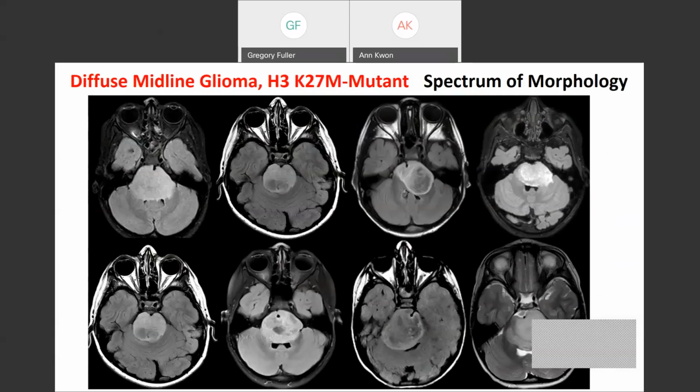These are eight different patients, so I'm not just showing you one patient. You've got to take my word for it. And I'm cherry picking. I'm showing you the four-leaf clover, the most beautiful example, like you see in textbooks. I'm showing you 8 examples of diffuse intrinsic pontine glioma, of which 80% are diffuse midline glioma H3K27M mutant. Or put it another way, of all DIPGs, 80%, the minimum, are driven by the histone mutation. And there's 20% of other molecular pathways, and these are confirmed.